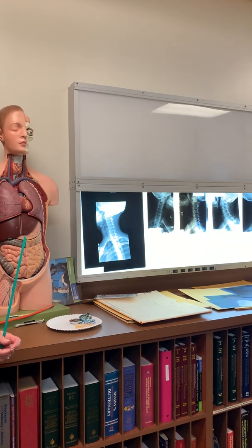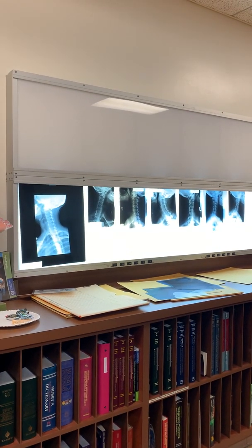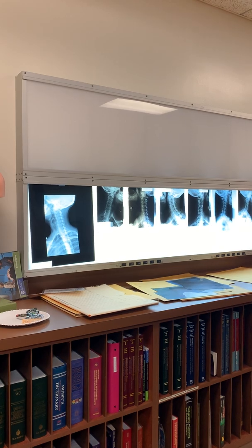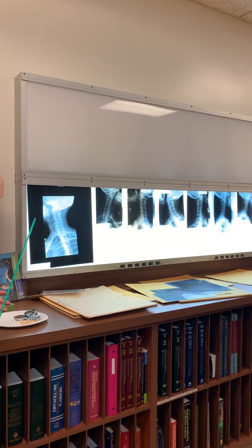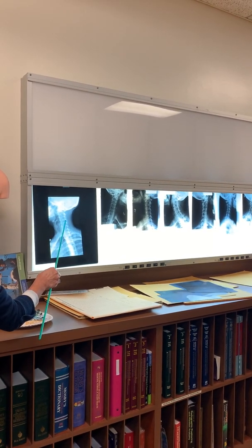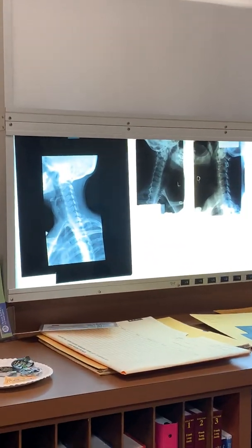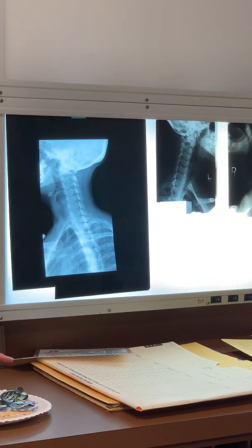Okay, so you know that it's an RPO. Do I know that it's not an LAO? No, because that would look exactly the same. The marker would be flipped around, however, but RPOs look exactly like LAOs when you put the image up. So let's just say it's an RPO. So here's the intervertebral foramen here, on the left side. Good. So that would be the left intervertebral foramen.